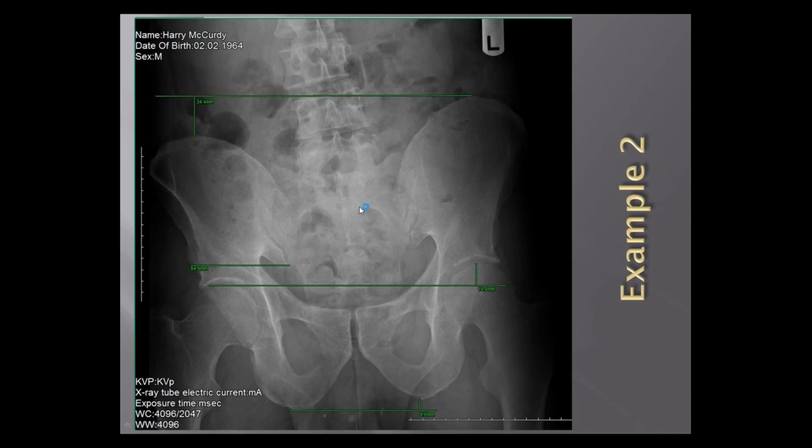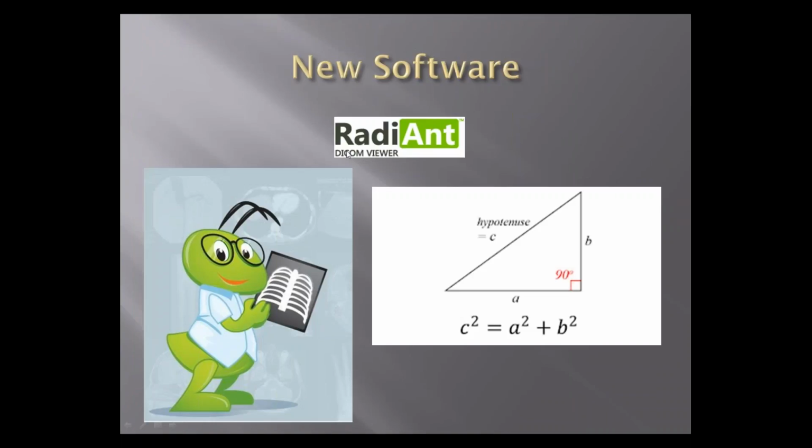Because we feel like it is that important, because this is a guy who helped us learn this lesson. We put him into a 24 millimeter ischial lift, and had him sit on that, and it made him way too high. And we're like, wait a second, why is that, right? So what I'm going to do, I'm going to show you here first. Let me drop down here real quick.